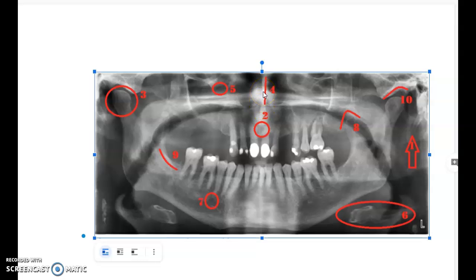We're going to move to number five, which is the infraorbital foramen. Foramen means hole, so a hole should be radiolucent. And if you look here, there's a radiolucent hole or radiolucency there, which is kind of oval shaped. And so it's round to oval, radiolucency seen inferior to the orbit of the eye. So the orbit is around here and sometimes superimposed in the maxillary sinus. So the sinus is here and it's usually inside or kind of in the middle of the sinus. So radiolucency there.